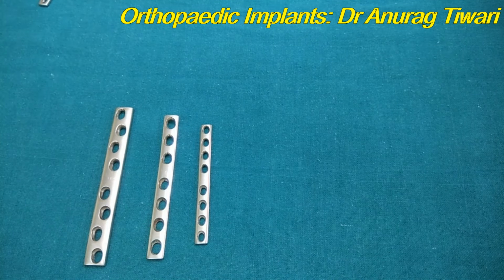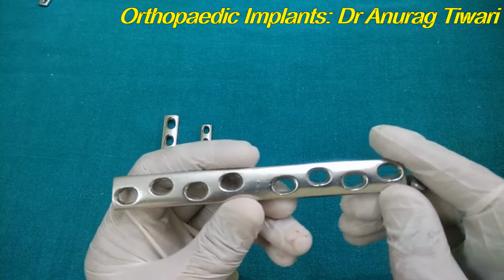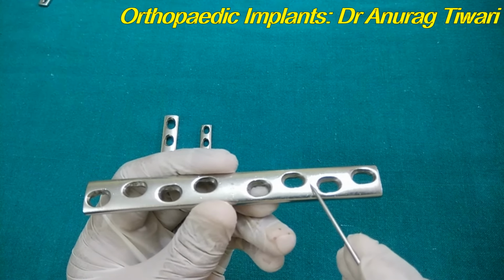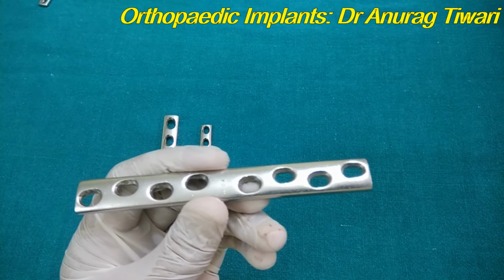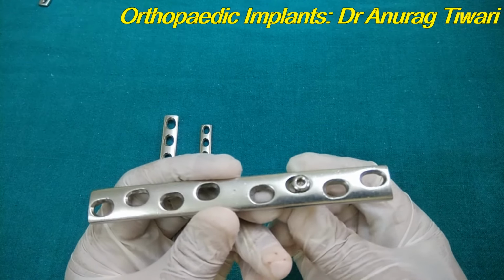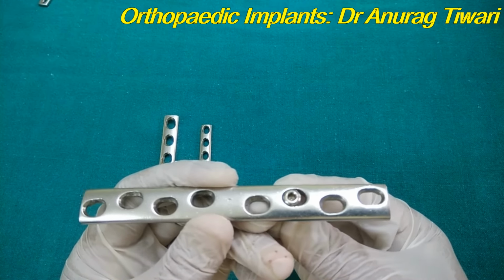Now the principle of the DCP is the spherical gliding principle. Just see here, the holes of the plate for the screws are oval in shape. They are not circular, they are actually oval, and they are a combination of an inclined cylinder and a horizontal cylinder. So we can say that in this cylinder the head of the screw will move like a ball. When we insert it eccentrically on one side, it rotates and moves. The ball moves from vertical to horizontal, and in this plane it can move.